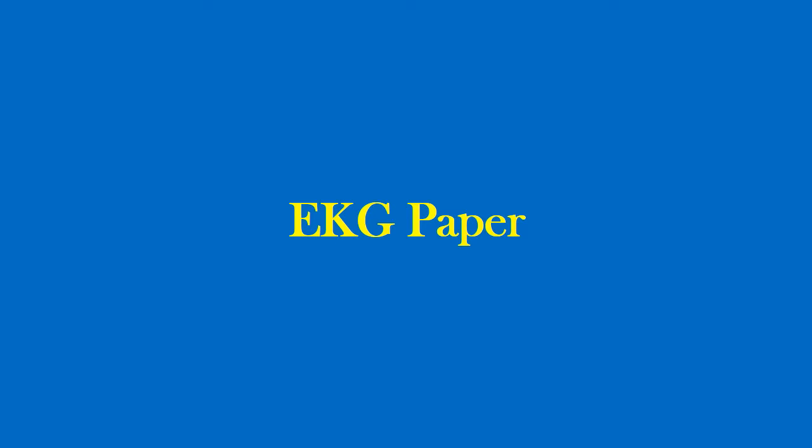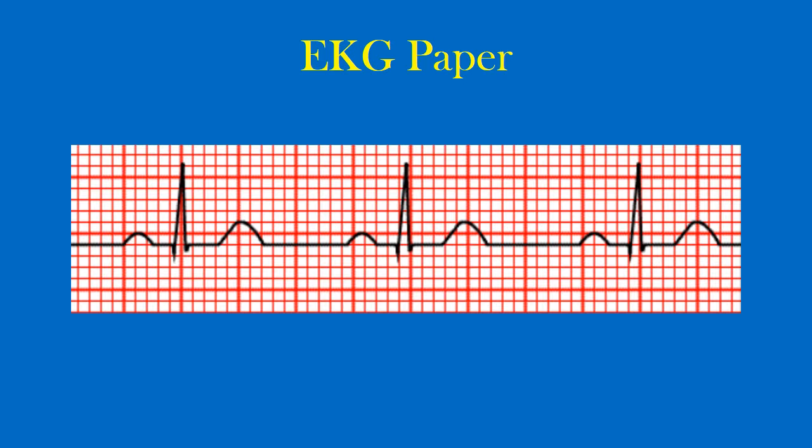In this lecture, we will look at the EKG paper. This will be important as we move forward in learning how to interpret EKGs. Let's start by looking at the grid paper that the EKG is recorded on.